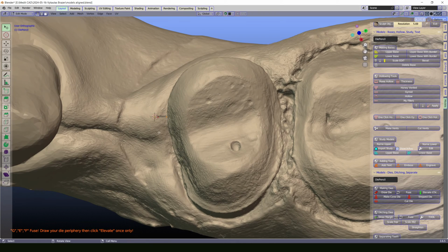Oops, I needed to select the target. Yep, now it's working. Now, like always, push the E to start drawing the line. I recommend to make it on as smooth as possible spots, because it's more complicated if we have a very uneven surface.